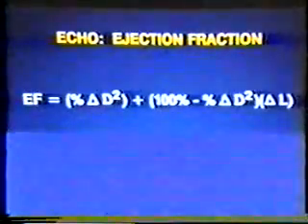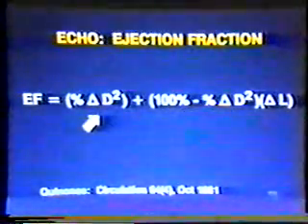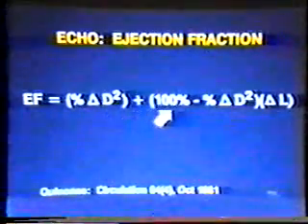In our laboratory, we attempt to calculate ejection fraction in nearly every case, regardless of the referral diagnosis. Programs are currently available which provide for online calculation of ejection fraction via tracing of the LV endocardium in systole and diastole, utilizing two orthogonal views of the LV from the apex. We still prefer to use the method described by Dr. Quinones and his colleagues. The bulk of the ejection fraction is determined from the fractional shortening of the square of the minor axis, to which is added the component for shortening of the long axis.